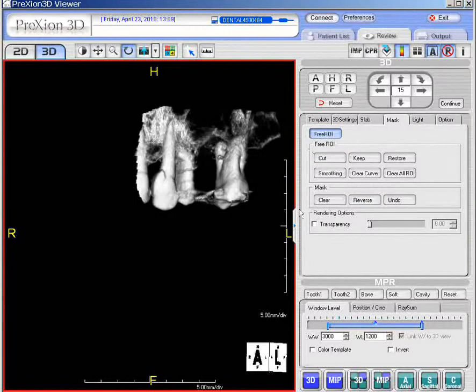Okay? So that's cutting and cropping, and you'll find it very helpful to your experiences using and evaluating specific areas in the dentition, and it allows you to rotate a 3D image, which is probably the most beneficial portion of changing from a CT to a MIP.